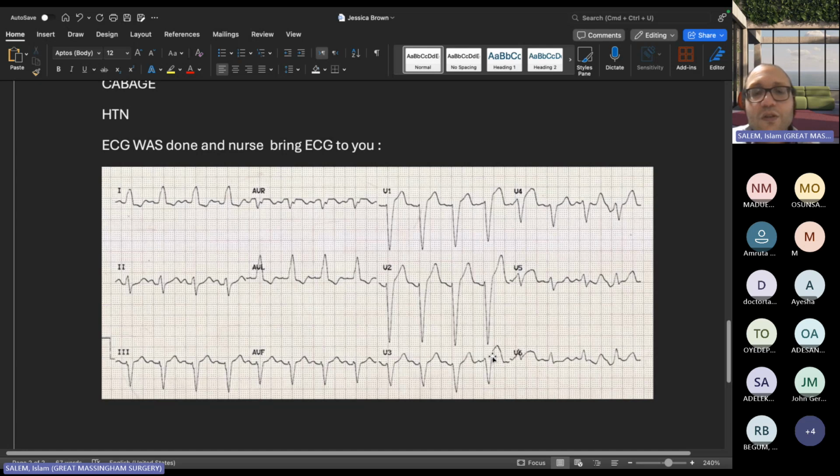Five big squares. I can't see. Yeah, maybe I can't. No, I can't see, because it's really small. Maybe you need to have an amplifier here. Yeah, I can amplify it a little bit. No problem.